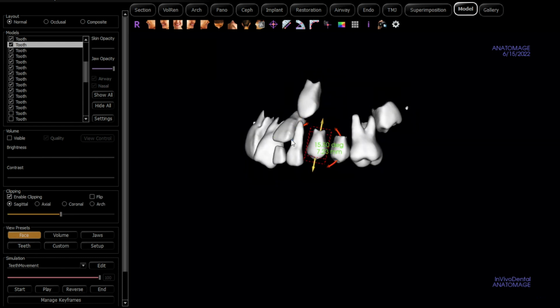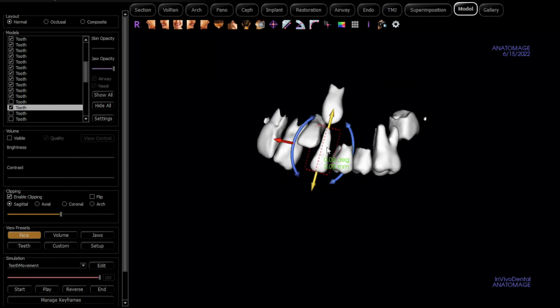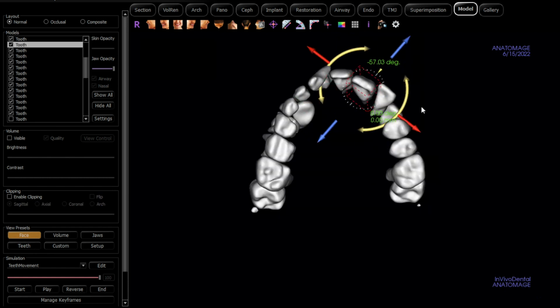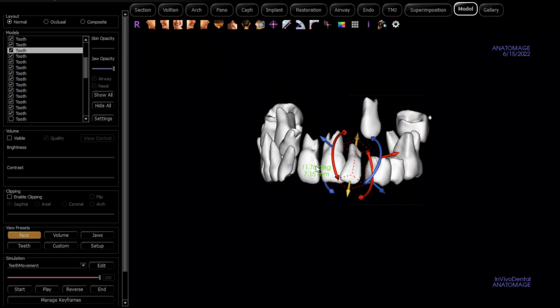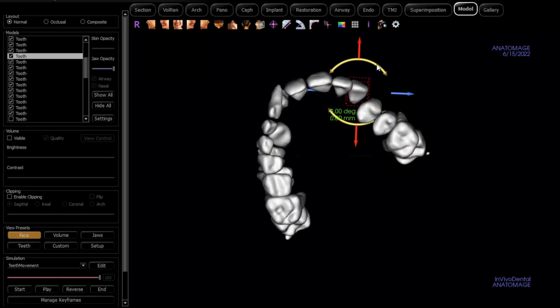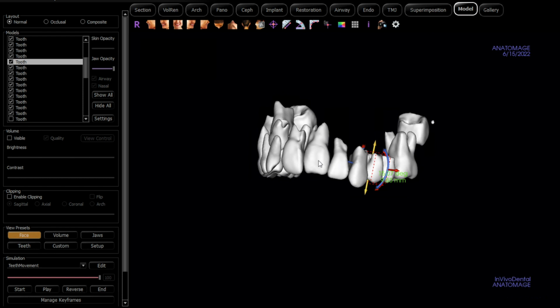In this case, I'm taking each tooth and putting them in place. I'm keeping adjacent primary dentition in place as well to make sure that I'm on the right occlusal plane. Here you can see we've got some teeth that need some rotations. I'm going to work with them. Now, knowing that I haven't necessarily been putting this with the adjacent or the occluding arch, I'm still just getting the teeth in the general position where we need them in order for me to then apply the lower arch to it and then look at our arch forms and the coordination of them. So that's what I'll do here.